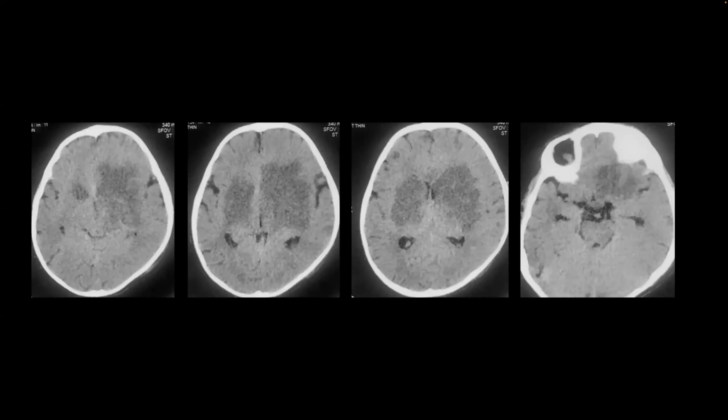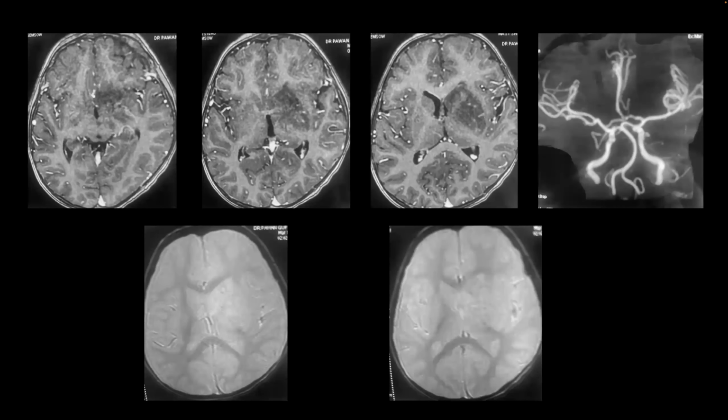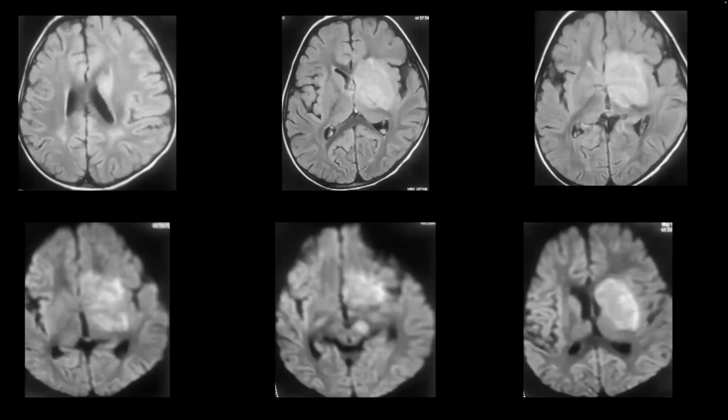I just had an outside thought. Is it a peculiar kind of tumefactive demyelination? So we did, as we all do, we gave methylpred. It didn't help. But is it not that everything is diffusion restricted, whatever the lesion you see? So there's no inflammatory component to it.